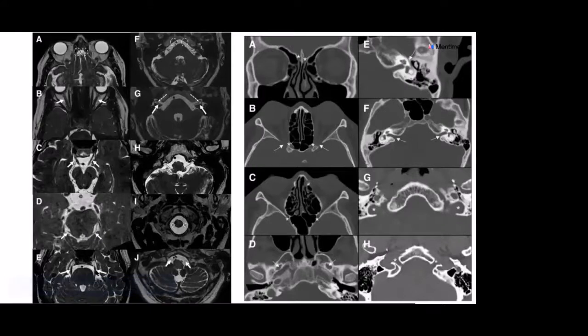The trigeminal nerve is the largest nerve, or you can remember that any cranial nerve which is entering this whitish structure is in the Meckel's cave. For the sixth nerve, these are two thread-like structures which arise from the pons, and then they enter into the Dorello's canals. 7 and 8 are easy to see because they have the cochlear and semicircular canals along with them at their ends.